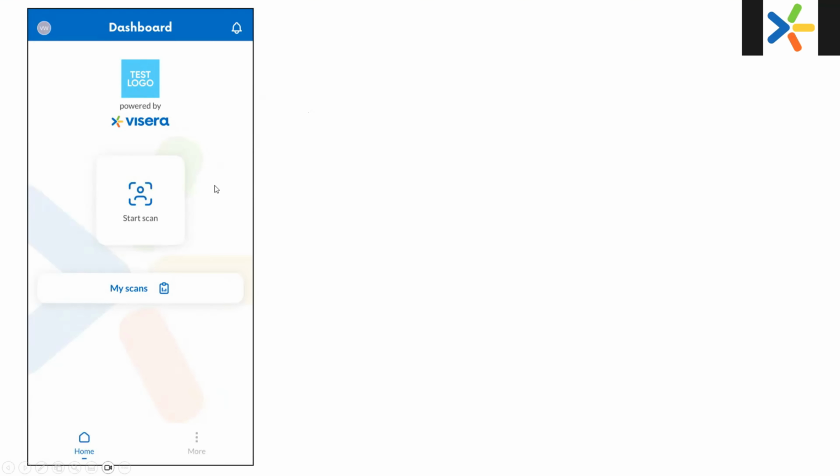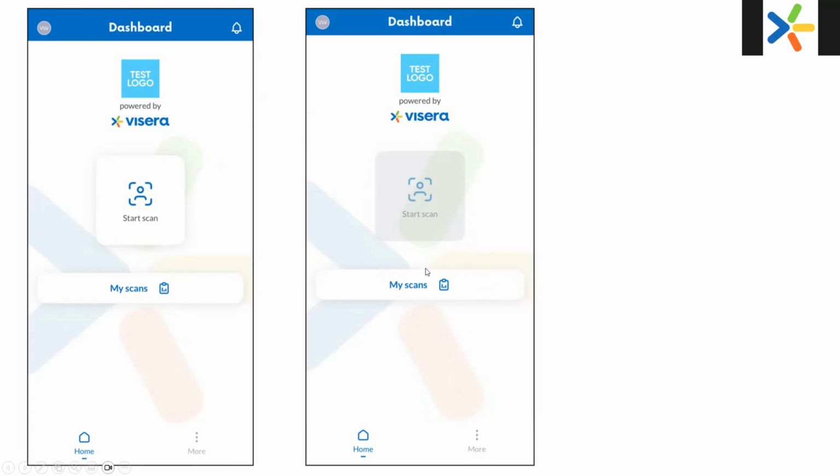When they actually have a scan to run, it'll look like this. They'll log in, they'll see the start scan button, and they'll run the scan. But as soon as they run that one scan, this is what it's going to look like now. Look at this, the middle of the screen. The start scan button will be grayed out. So in other words, they're not going to be able to run a scan again. And visually, it'll be grayed out.